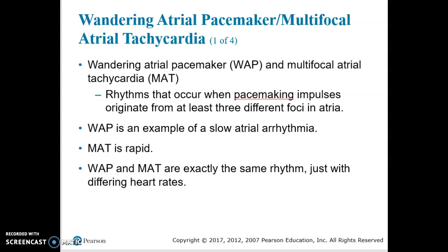Chapter 8, Video 2. In this video, we're going to talk specifically about wandering atrial pacemaker and multifocal atrial tachycardia. Wandering atrial pacemaker and multifocal atrial tachycardia are also known as WAP, W-A-P, or MAT, M-A-T. With wandering atrial pacemaker, this is an example of an atrial rhythm. The key difference with wandering atrial pacemaker and multifocal atrial tachycardia is the heart rate.